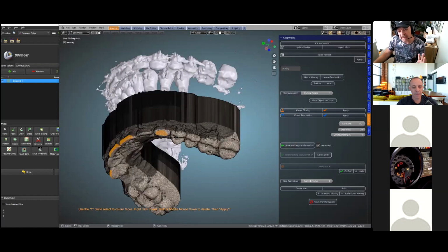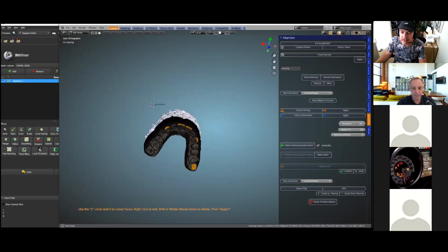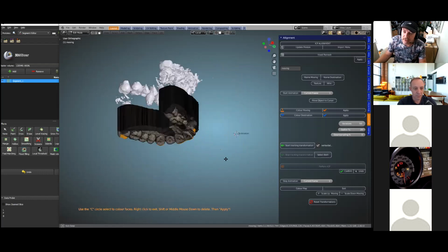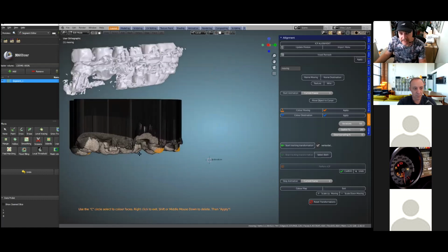So when you're painting these, think of the X, Y, and Z. If you can lock points X, Y, and Z, then you'll probably get quite a close match. So this one would be in the Y direction, this would be X direction, this one would be the Z direction. Okay, and then I'll look for the other molar. Now, unfortunately, there's not much to be seen over there.